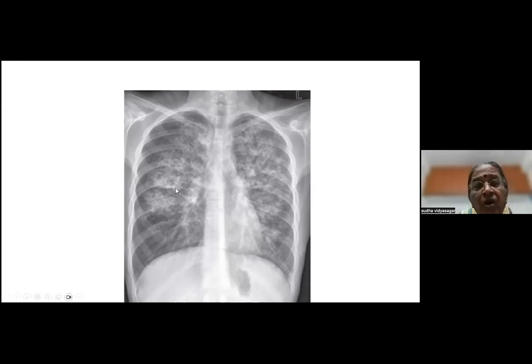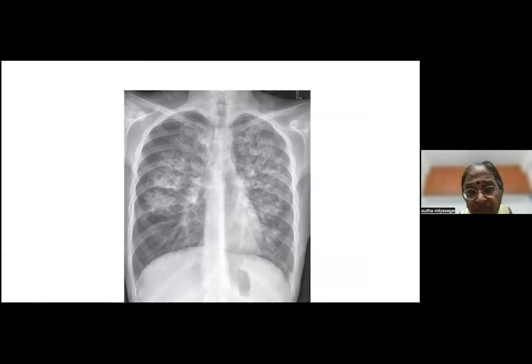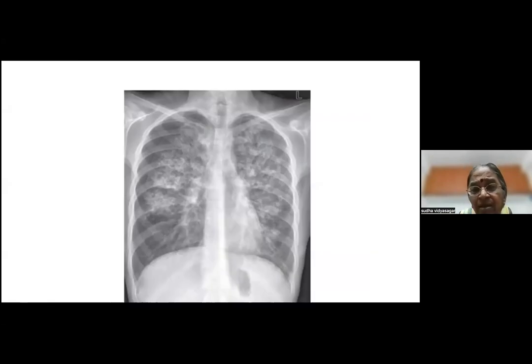Okay, right. So you got bilateral, correct. It's a bilateral reticular nodular shadowing, okay? And not pulmonary edema. Pulmonary edema is what I showed you. It will not be like this. It will be hazy. See the haziness here? This is pulmonary edema, okay? It's not hazy, okay? It's got nice fibrotic, kind of white things are there. It's not hazy like the fluid here. This fluid will clear with your diuretic. You understand? This is not that.